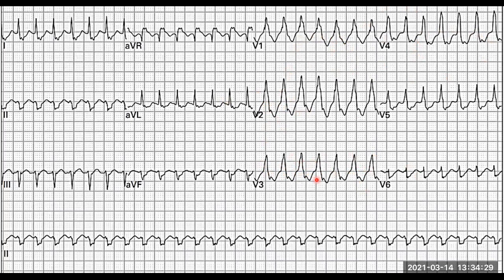So this is quite typical of a ventricular tachycardia that we see. Okay. So the other way that I always describe it to people is it looks like vampire's teeth, dragon's teeth, if you turn it upside down and things like that. But that doesn't mean that we've got the diagnosis. We just need to sit by and wait. We still need to look through what we can see in each zone just to check. Now, in saying that, there's a few caveats at the end, but we'll get to that, all right?